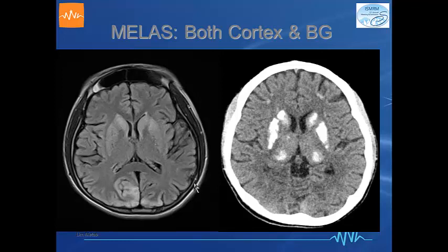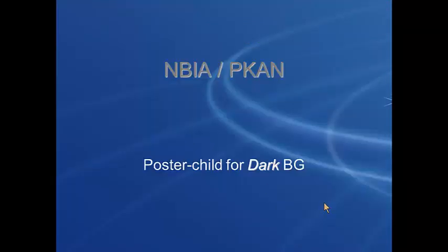But when we did the CT following that, we discovered that there was probably long-standing recurrent attacks giving rise to calcification of the basal ganglia.